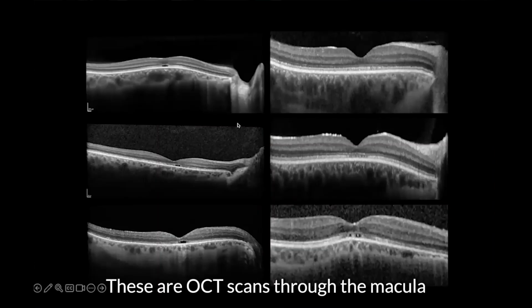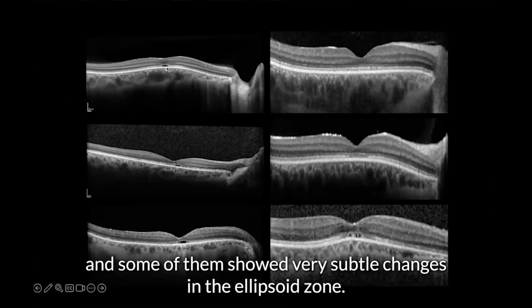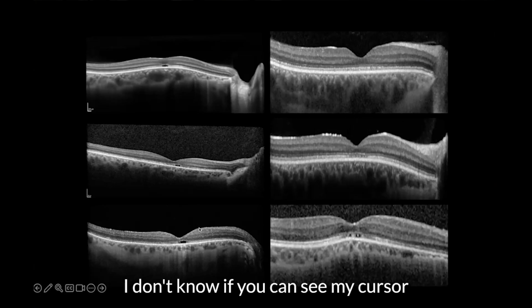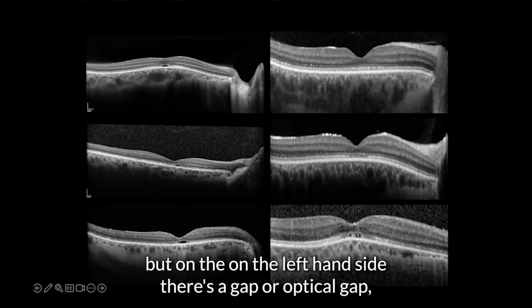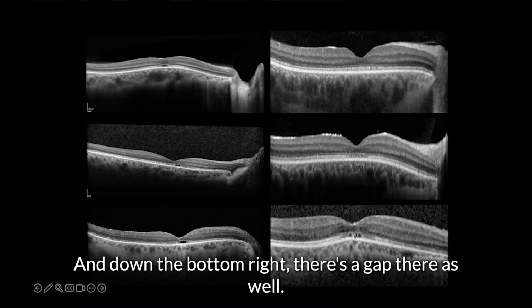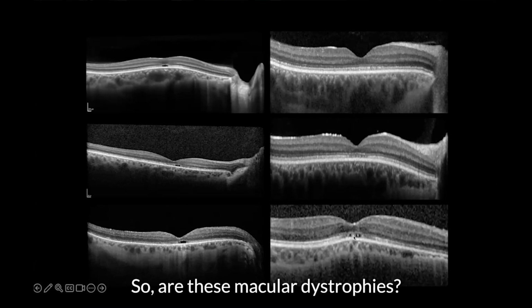These are OCT scans through the macula, and some of them show very subtle changes in the ellipsoid zone. For example, these, I'm going to use a marker. I don't know if you can see my cursor, but on the left-hand side, there's a gap or optical gap. On the right-hand side, these 3 OCTs show attenuation or abnormality in the ellipsoid zone. And down the bottom right, there's a gap there as well. So are these macular dystrophies?